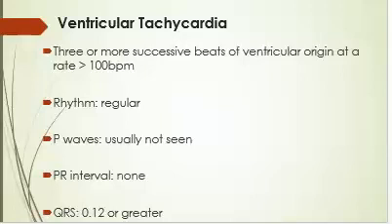So ventricular tachycardia is actually considered a life-threatening dysrhythmia because of the decrease in cardiac output. What you have on here is a rate that's really fast. It is regular, though. Imagine that. But you can't see any P waves. If there's no P waves, obviously there's no PR interval to look at. And the QRS, look at that. It is greater than 0.12. So this is nice and wide, and remember I said we like that QRS to be narrow.